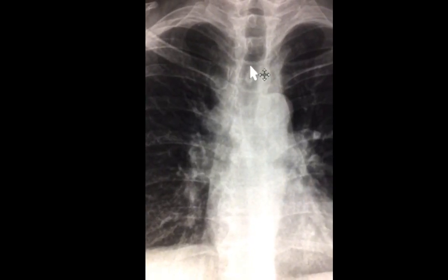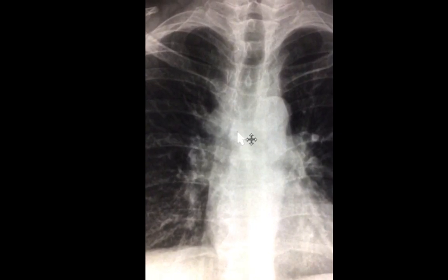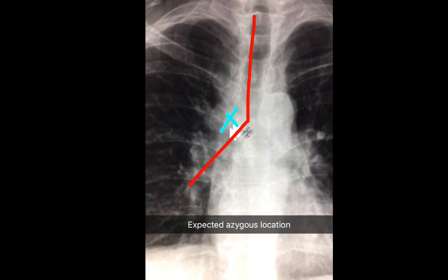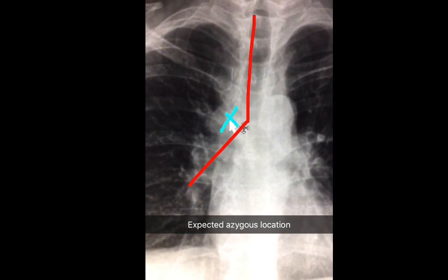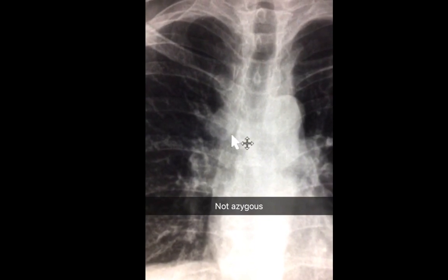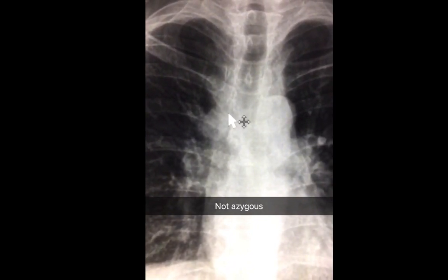A little bit of anatomy. This is the trachea, this is the carina, and this is the right main stem bronchus. The tracheobronchial angle is where a normal rounded or oval structure lives. This structure is the azygos vein. So one of the thoughts that could cross your mind is that this could be a distended azygos. However, in this case, this is not.